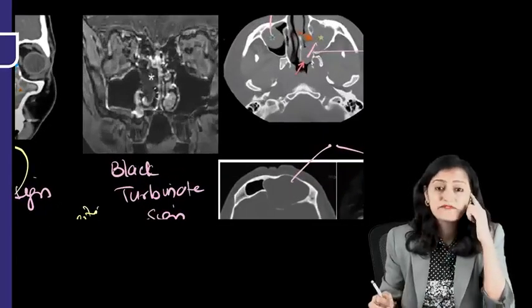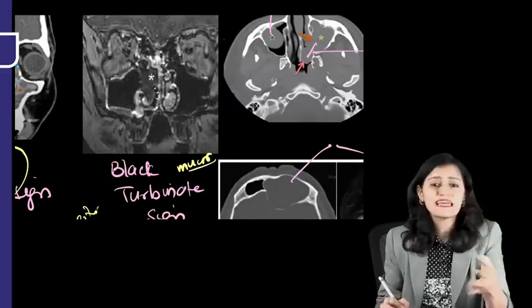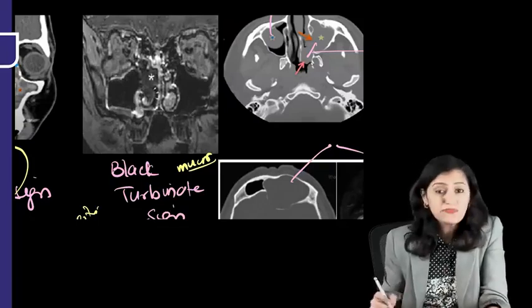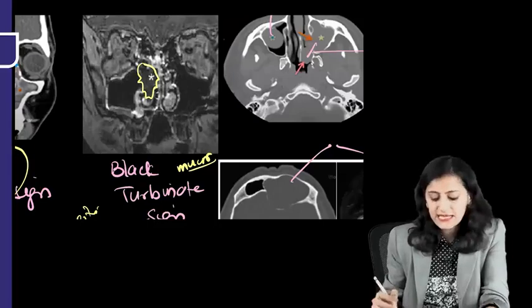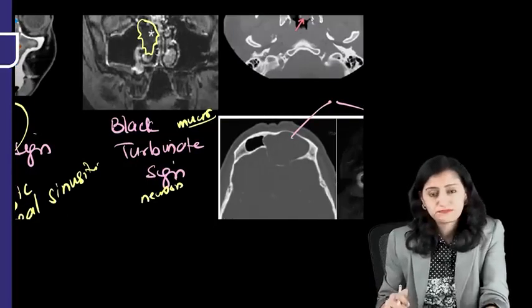Next, what do we see here with mucormycosis, which we saw with the COVID-19 diabetic patients on steroids, right? So the mucormycosis, the black fungus, caused this black turbinate sign. The turbinate is not enhancing because of the necrosis.